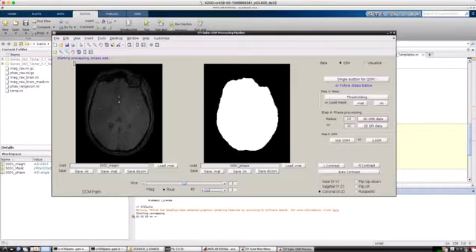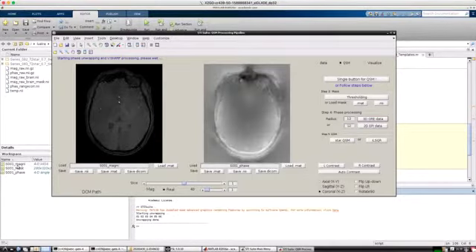So do not click on anything else before it has finished whatever process it is doing. Notice as well that there are some variables saved in your workspace. Here there are the variables that you have uploaded, the magnitude, the mask, and the phase, and others will be appearing here, especially, for example, the filter phase.